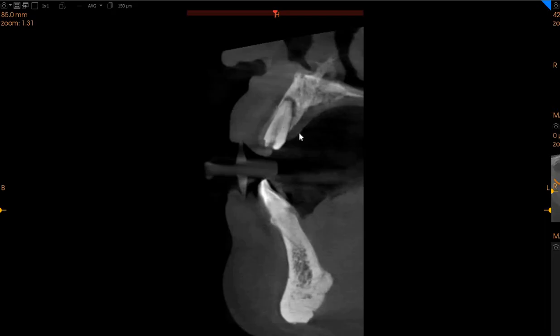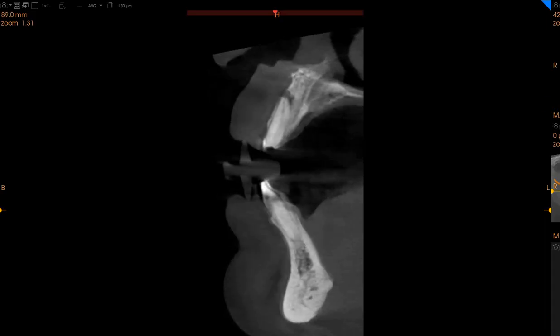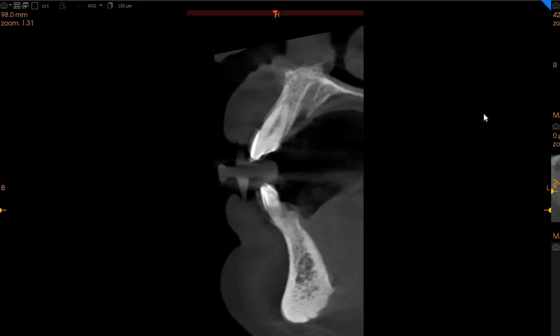Again, if this is extracted, we've got a periapical radiolucency, 6 millimeters of width with approximately 15 millimeters of height. In the region of the central incisor, periapical radiolucency with a buccal plate perforation, 7 millimeters of width, 16 millimeters of height. This is the central incisor on the left hand side.